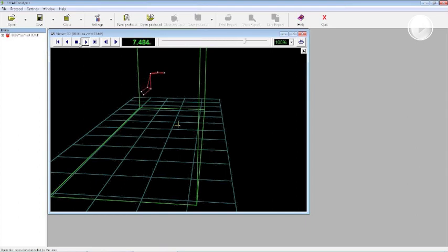Okay? Here, in the folder of the trial that we are analyzing, that is test03.tdf, here we have inside the trial two different folders. The first one is the 3D points track. If I open this folder, I can find all my markers here. Each marker is composed by the three components of the movement of this point in the space.